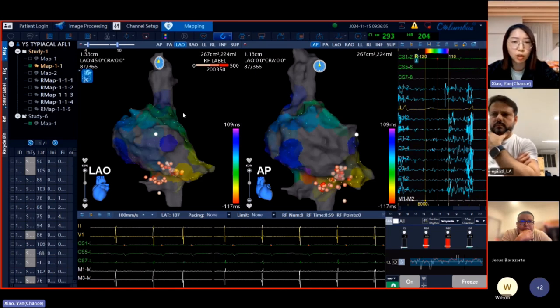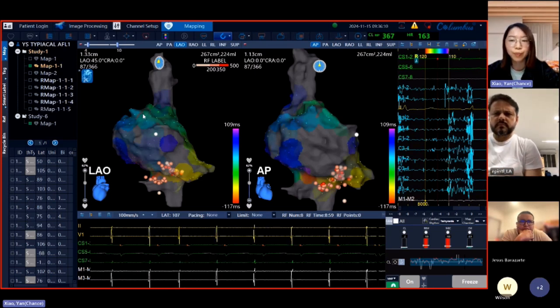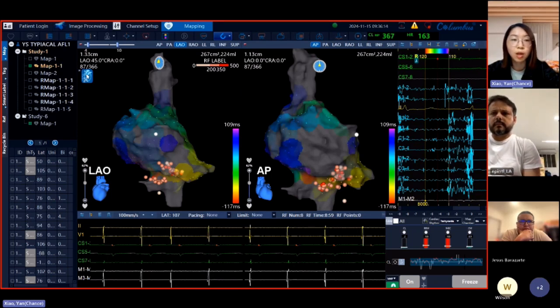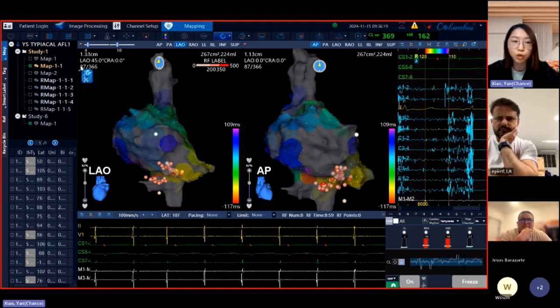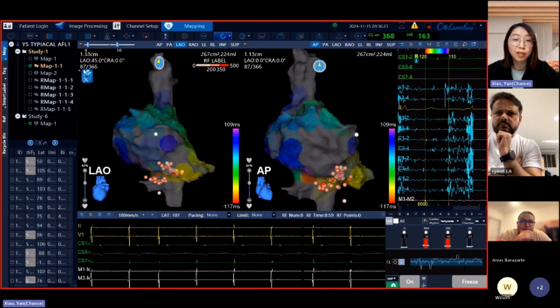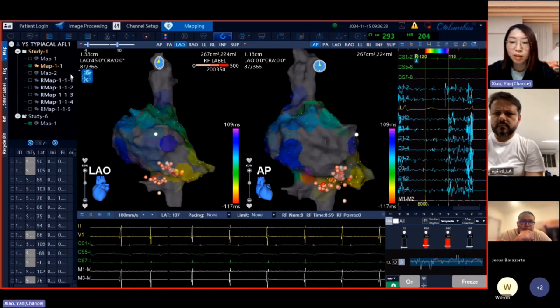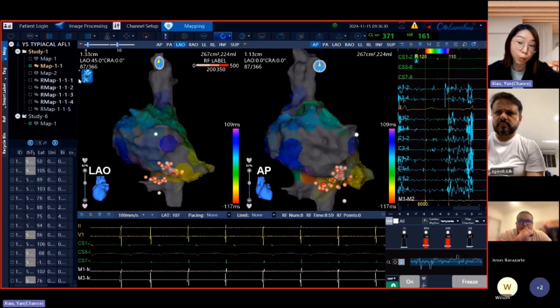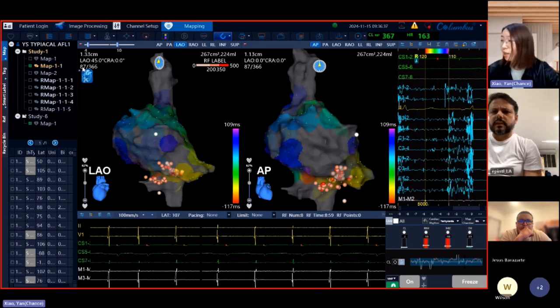On this new software version, our R&D colleagues optimized this, but so far I could not get enough data to show you the detailed value. So previous reference, the points limitation projected on the geometry should be less than 3,000. Then everything will be smooth, okay? If you have any questions, just stop me and we can discuss, okay, Jesus?